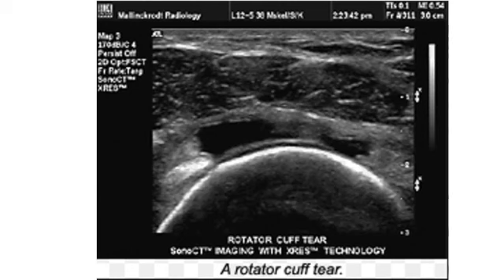So here's another rotator cuff tear. And if you guys aren't catching the theme, I really like rotator cuff tears with ultrasound imaging. In this image of a rotator cuff tear, definitely look at what areas are hyperechoic and what areas are hypoechoic, and be very comfortable with how this image looks, because these are images that we're definitely going to see on the final examination for this course. We're also going to see these clinically as well.